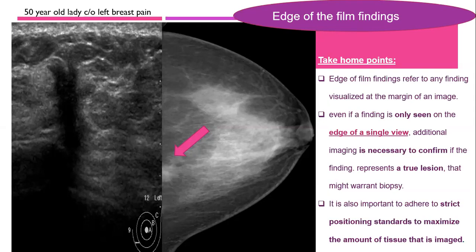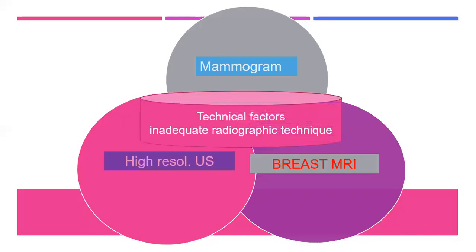It is very important to adhere to proper technique so as not to miss the cancer. So we had three examples demonstrating inadequate radiographic techniques.